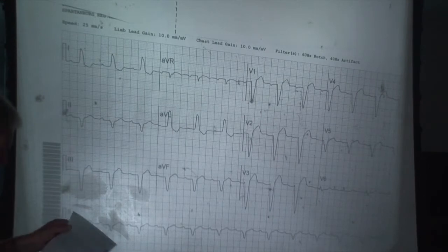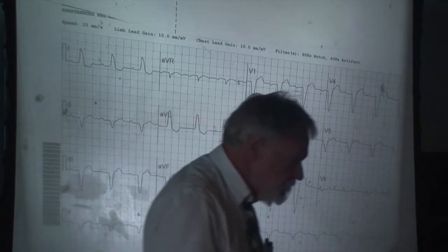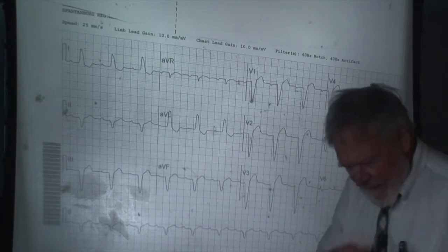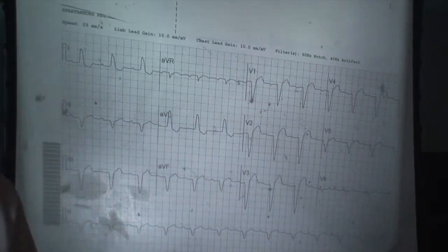What's the clinical difference between a right bundle branch block and a left bundle branch block? Left is almost always due to ischemic heart disease. Right, a left is a pathologic event. It can even signal acute injury. A brand new left bundle has to be considered suspiciously as an acute injury event.